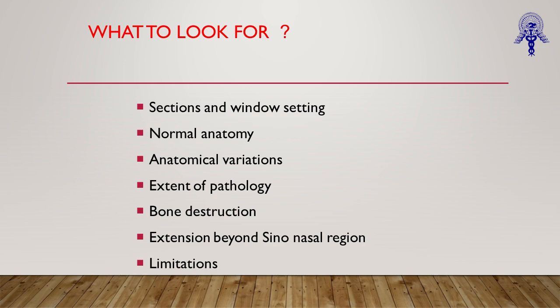And if you have a higher Hounsfield unit, so the scans are taken in both soft tissue and bone window, which means changing the Hounsfield unit. So you may not be able to see the character or structure of an optic nerve in a CT scan if you are seeing the bone window. If you are seeing the soft tissue window, which is taken in lower setting, so when you read a CT scan, there is always written in the lower part W.